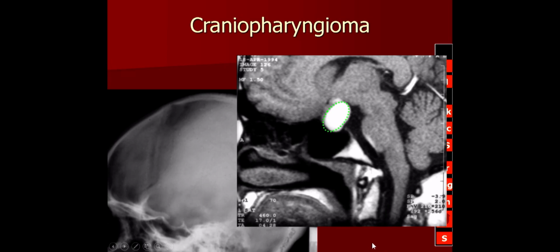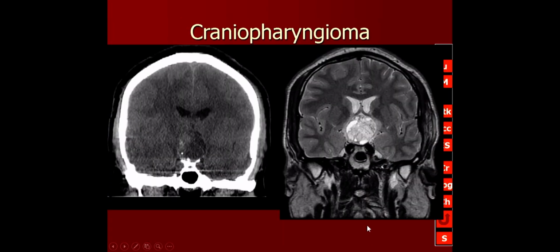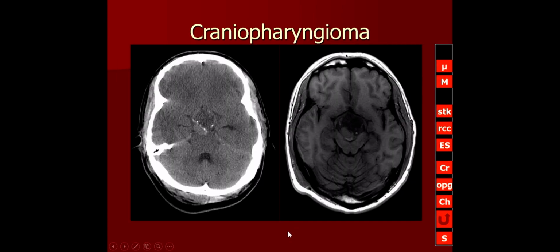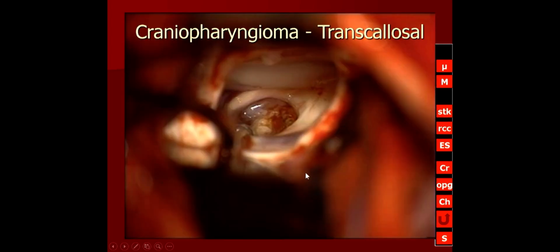So all of these things make sense when you try to put them together for the craniopharyngioma. So here's another craniopharyngioma. I must emphasize they can have widely variable imaging appearances depending upon the ratio of solid tissue to that oily contents. They can be very, very heterogeneous, as you see here. The solid portions almost always show contrast enhancement. A few calcifications here, but all of this is the lesion. All of that is the lesion in this patient with craniopharyngioma.